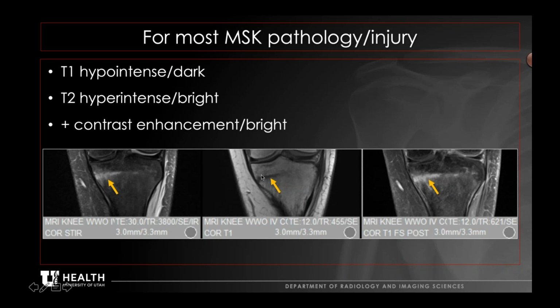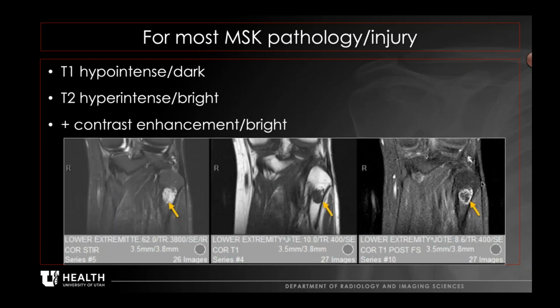The reason it's hypointense is because the normal structure of the bone gets compressed. All of those trabeculae are actually being compressed, and it shows up as this dark line here. And then they enhance because edema enhances. You can have all of these inflammatory cells that are reacting, and that all causes enhancement. The same is true for tumor. So this happens to be a tumor in the bone.